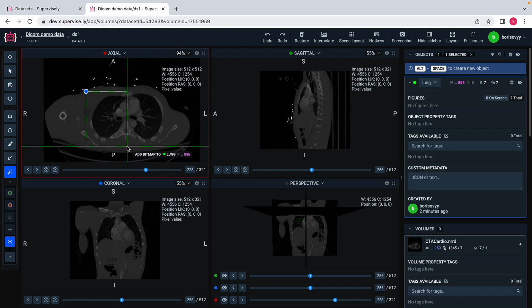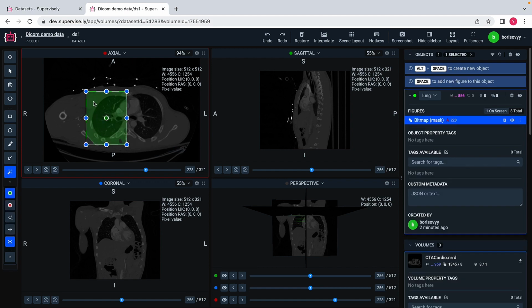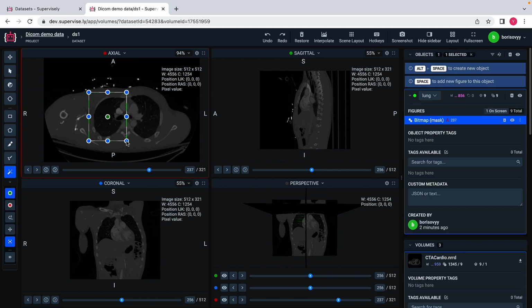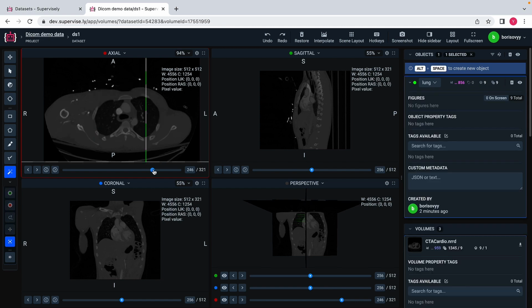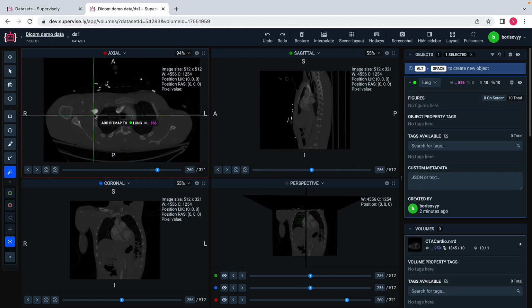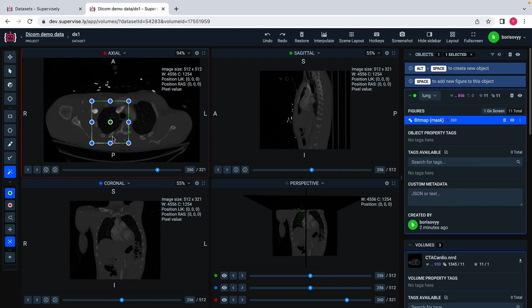And you see, if we rely on Smart Tool that was not trained to deal with medical data, we still are quite efficient at labeling individual slices. So a couple more. I don't know whether I have to exclude this part. Okay, let's exclude that, and maybe this one as well. Okay, let me do the last one like this.